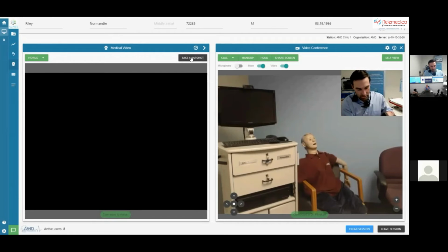We can even connect, say, an ophthalmoscope. Maybe you're doing diabetic screening.